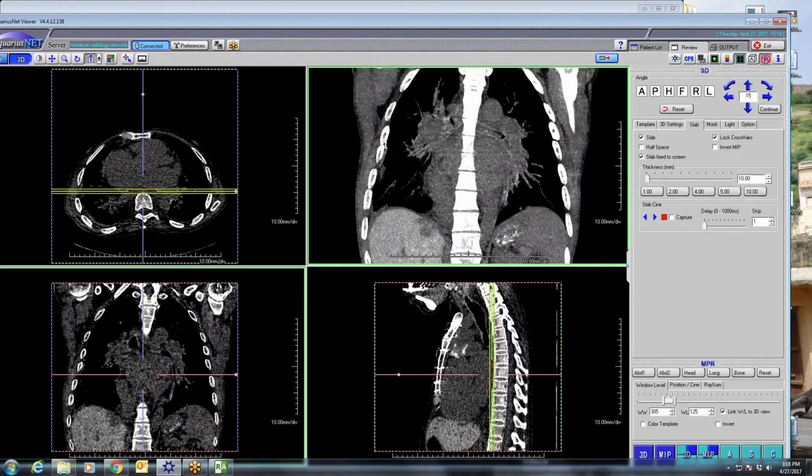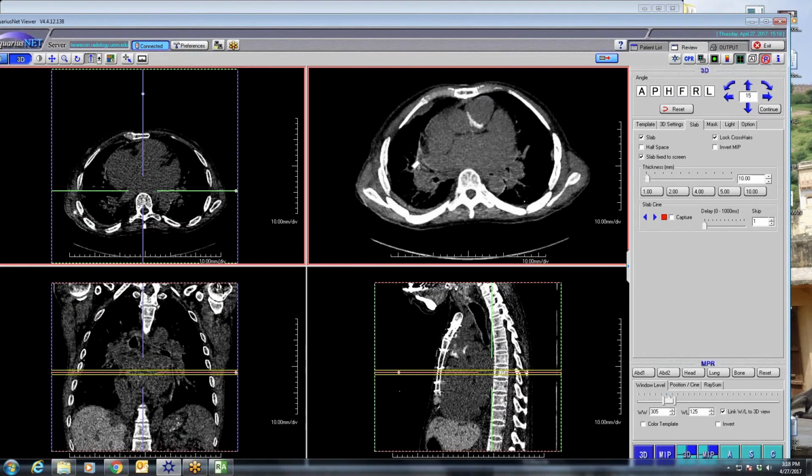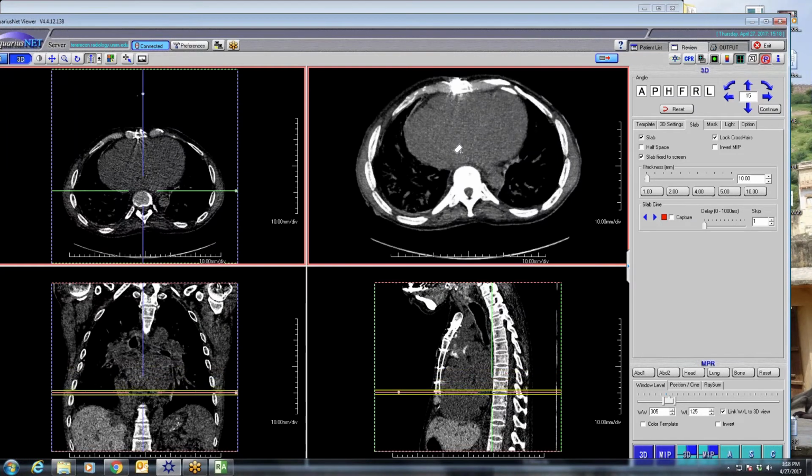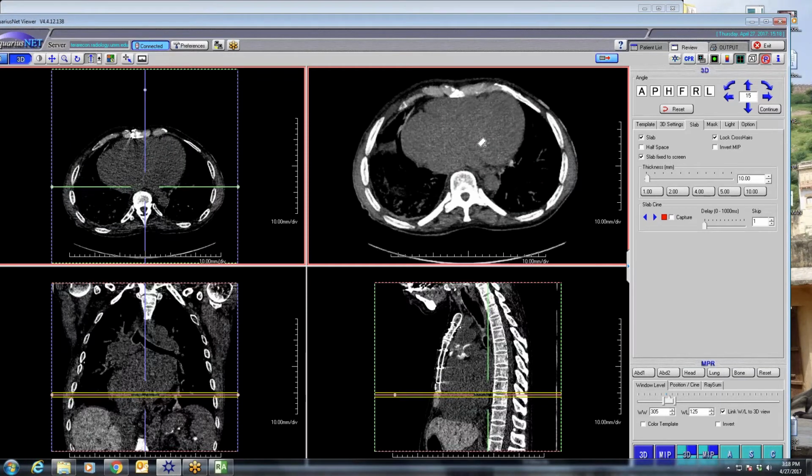Yeah. And I just haven't seen a liver this dense, but I didn't realize it went into the skin. That's actually quite interesting. And you're right. I mean, looking at it on the MIPs, there is some skin attenuation, so kind of interesting.